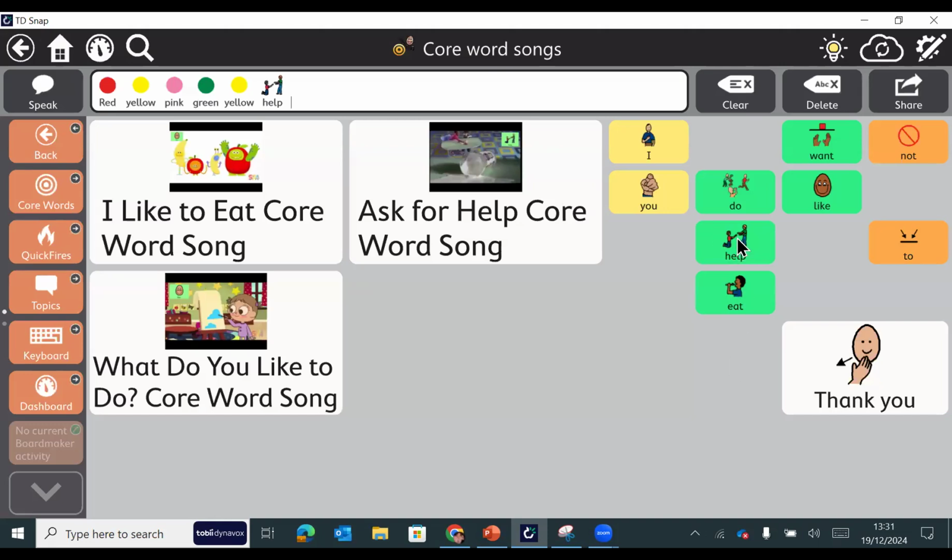So then I can be off here and say help. And one of the things the dinosaur at the end says is make sure you say thank you. Thank you.